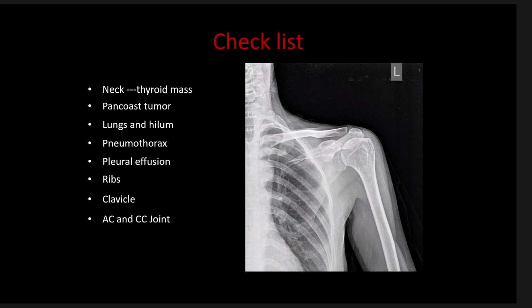And for example, if you're seeing a pneumothorax on a CT scan, always look for the plain X-ray. You might have a plain X-ray in your PACS system, and always look retrospectively again for the avascular area and visceral pleura. So these are the ways where you have to keep learning and train your eyes.